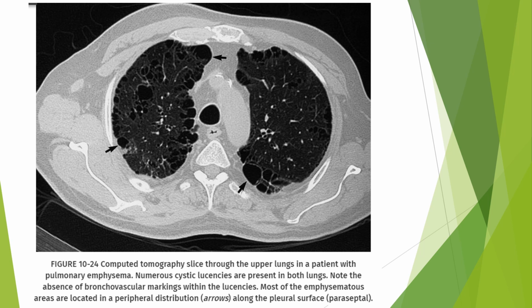So when we're looking at the apices, this is a patient that has a lot of cysts, and you can see all these little bubbles. Do you see all these little things? They've got some arrows pointing to them, highlighting them. That almost looks like a honeycomb pattern, but it's not quite. These are just blebs and bullae. Like I said, remember there are little aneurysms of necrotic tissue going on. They're all over this place, and I could spend all day circling all these.